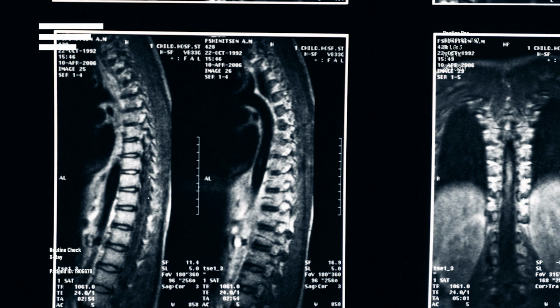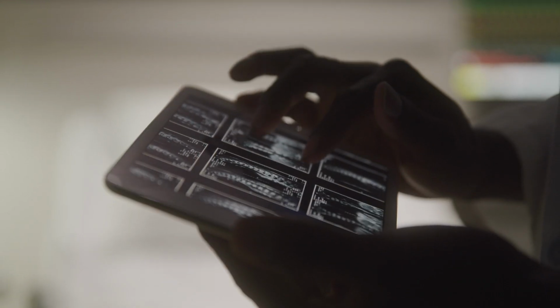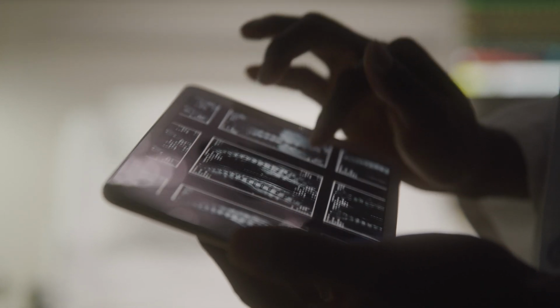A patient's Cobb angle is a measurement that's determined during a scoliosis X-ray, and this involves drawing lines from the topmost tilted vertebra to the curve's most tilted vertebra on the bottom, and comparing the tilt of each of these vertebrae to each other. This angle is expressed in degrees, and typically the higher the Cobb angle, the more severe the scoliosis is.